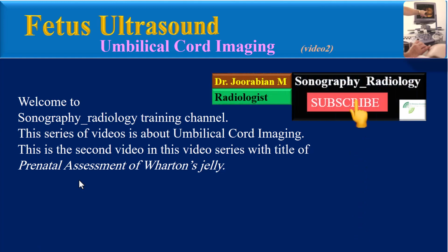This series of videos is about umbilical cord imaging. This is the second video in this series, with the title of Prenatal Assessment of Wharton Jelly.